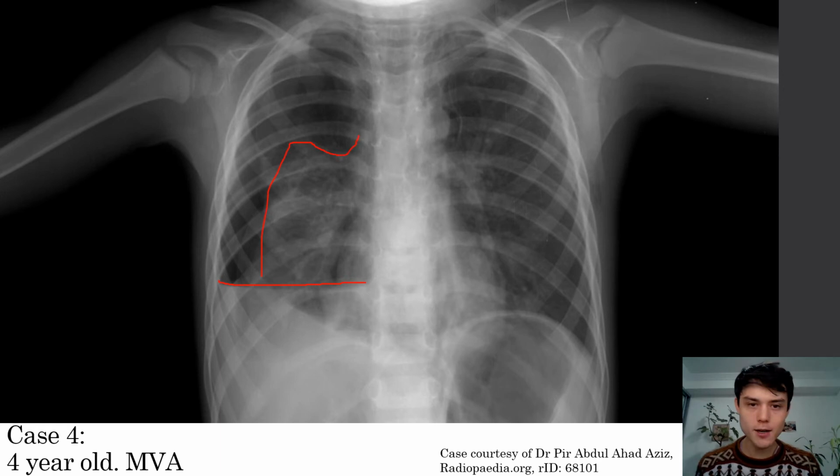And this is the air above the fluid in the pneumothorax, where we see that the vascular markings of the collapsed lung don't extend all the way to the border of the chest. Instead, we have this area of translucency with no vascular markings of a pneumothorax. And we also have, in this chest X-ray, pneumomediastinum, where we see in the mediastinum various anatomical structures being outlined by air, such as this aortic knuckle. We see some lines of air running through the mediastinum on both sides, the right and the left.